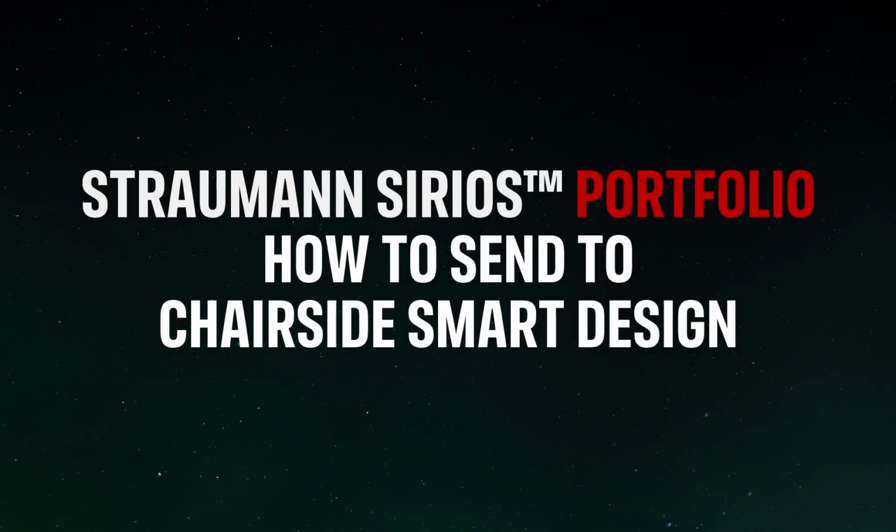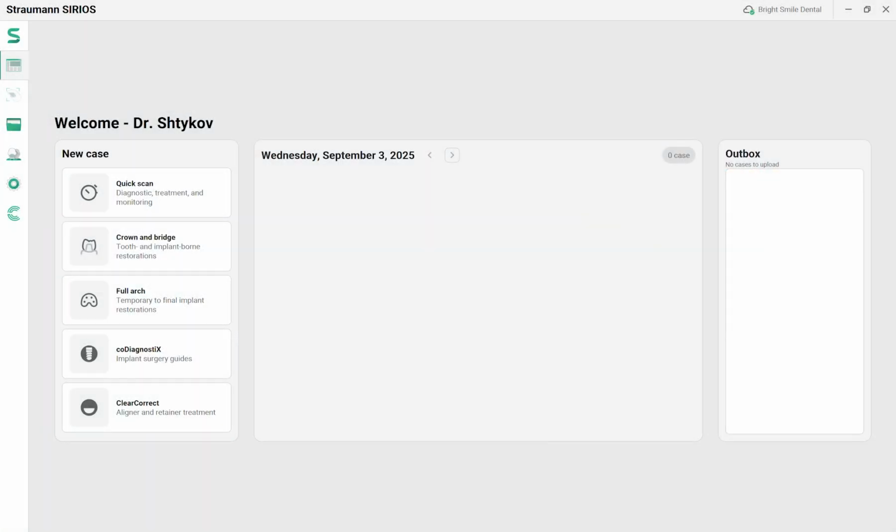Straumann SIRIOS portfolio. How to send to Chairside Smart Design. Select Crown and Bridge to create a new patient case.